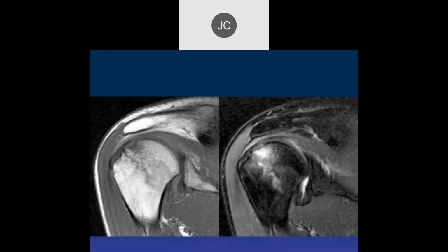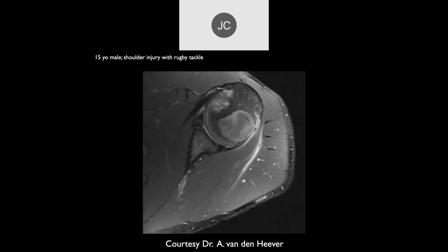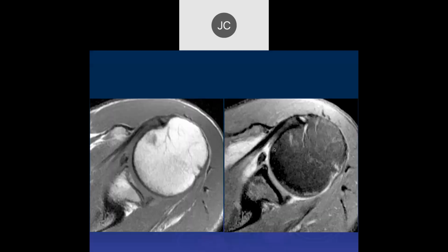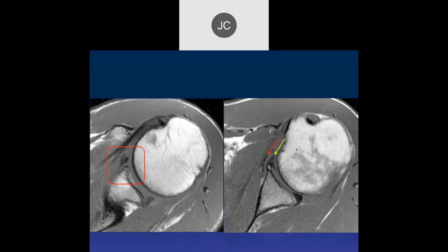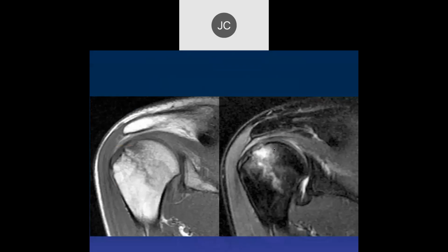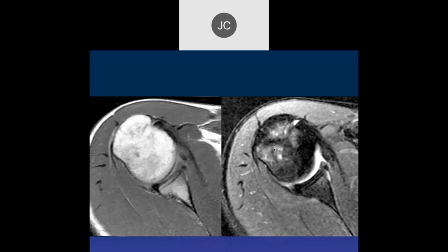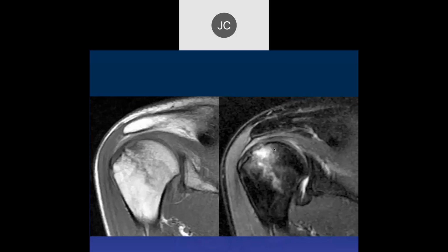Okay. So what are you concerned about? Let's go back. Maybe like an avulsion of the supraspinatus tendon. The history here is this patient had a recent injury, shoulder injury. Wrong patient. Patient had a recent injury. So what do you think the injury was? I mean, it could be like a dislocation.